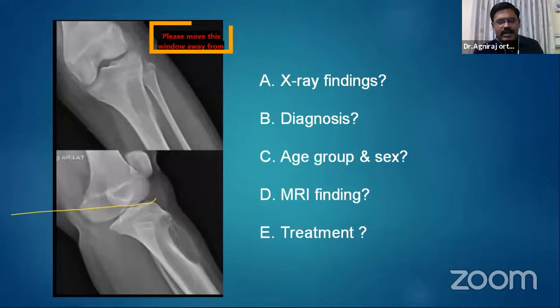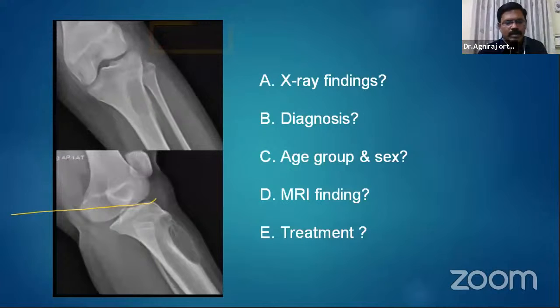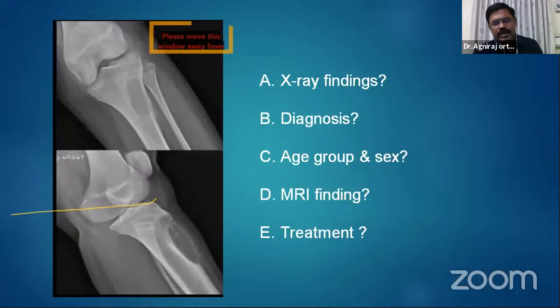So we have finished. Any complications like pathological fracture or cortical breach or soft tissue extension, are you able to appreciate or not? Sir, able to appreciate cortical breach in the lateral view of the proximal tibia. Okay, in the lateral view, there is some cortical breach, accepted. So what is your diagnosis, or you can give a differential diagnosis also? First diagnosis, what do you want to say?